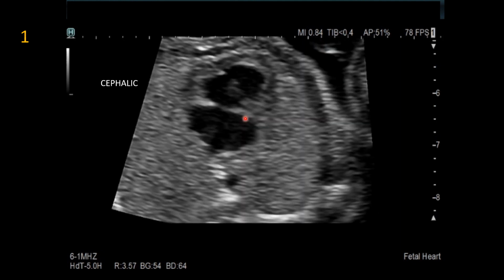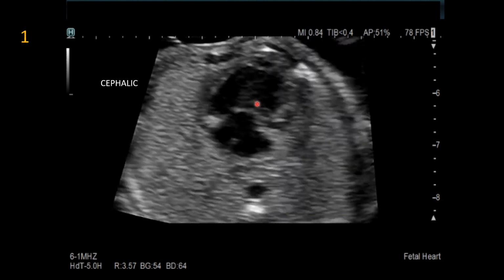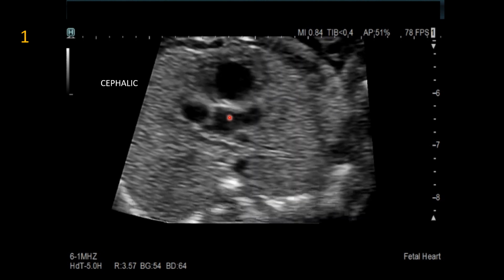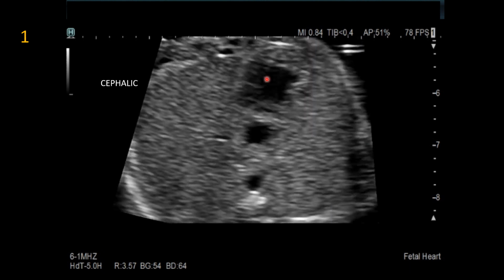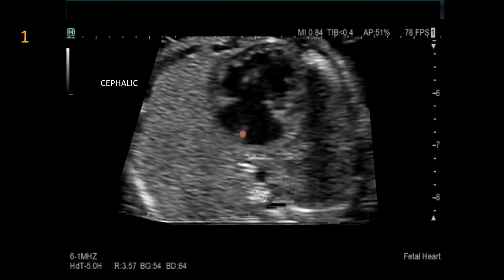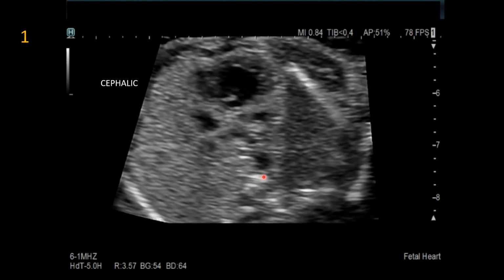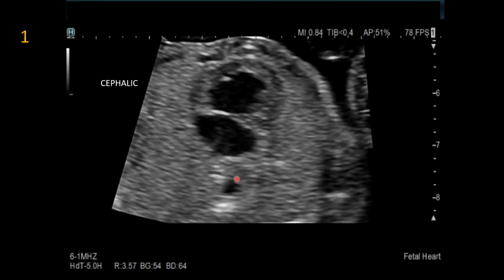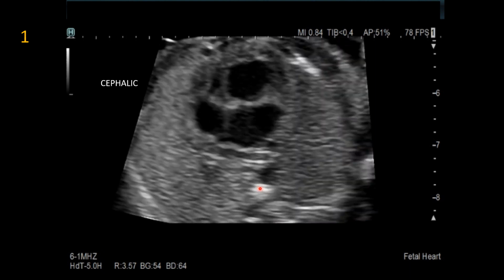And so focusing more on that, again, complex congenital heart defect with unbalanced complete AV septal defect, a dominant, what appears to be maybe right ventricle, and again, a large primum ASD here, and the IVC appears to be intact. Again, this is the aorta on the spine, and we're not seeing a dilated azygous or hemiazygous vein.